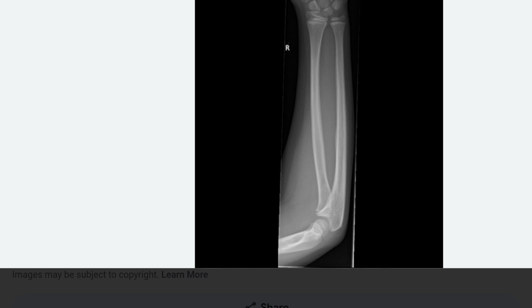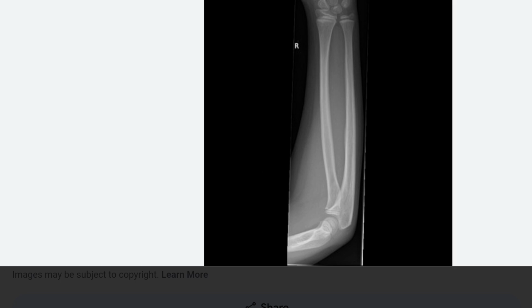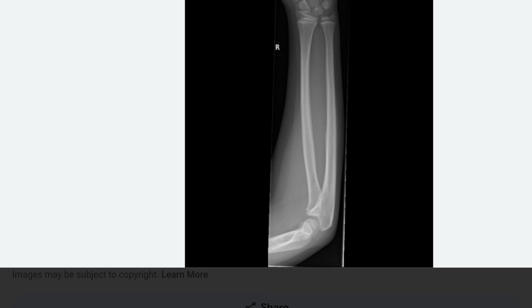Do you see something wrong in the radiograph and why? There is a band or tie at the wrist, which should be immediately removed as it may cause a strangulation effect producing compartment syndrome.